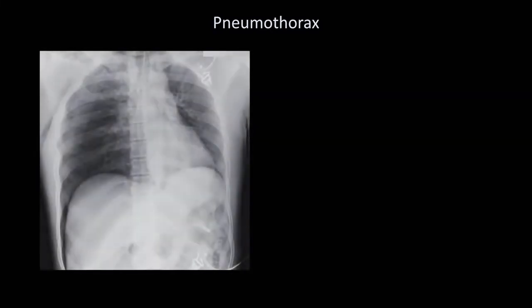Lastly, there is a specific appearance of a pneumothorax that is occasionally seen in AP films of semi-recumbent patients. What do you notice here? The right costophrenic sulcus seems quite pronounced. This is called the deep sulcus sign and is an indication of a pneumothorax.